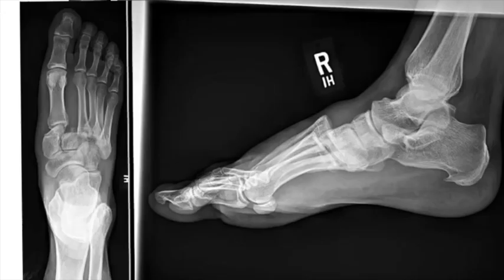We're going to look at this foot and apply some of the same principles that we just talked about. Here we're looking at smooth, right? Smooth, smooth, not smooth, right? That's clearly not where the metatarsals are supposed to line up on the lateral. If you look on the AP view, while this is smooth, there's a big gap between the first metatarsal and the second metatarsal. That gap is a Lisfranc injury. This appearance on the lateral is indicative of a Lisfranc injury. And while this is a rather obvious Lisfranc injury, the gap here can be pretty subtle, and it's something that you don't want to miss.